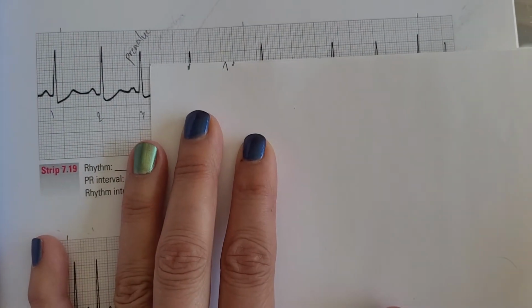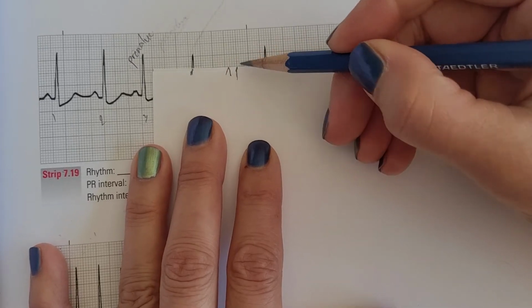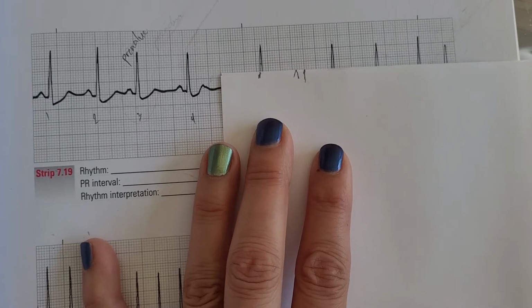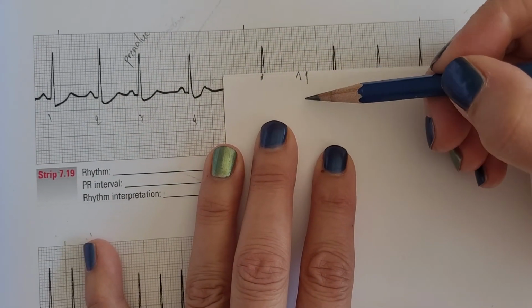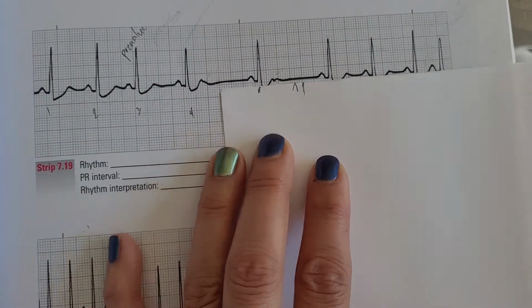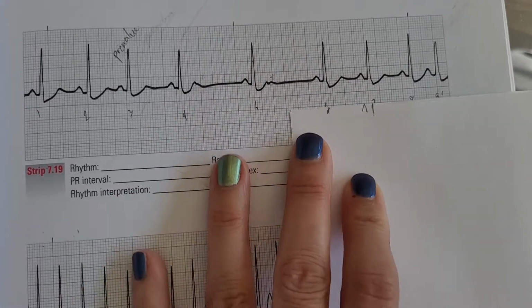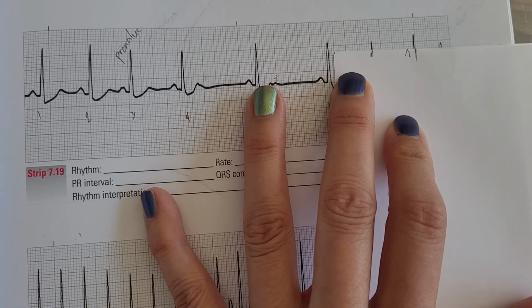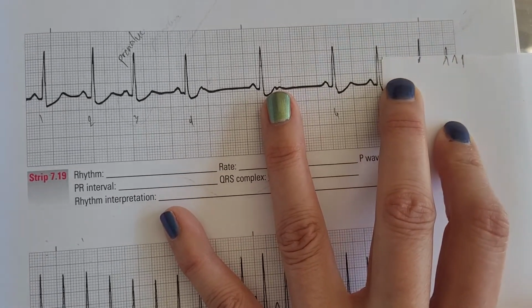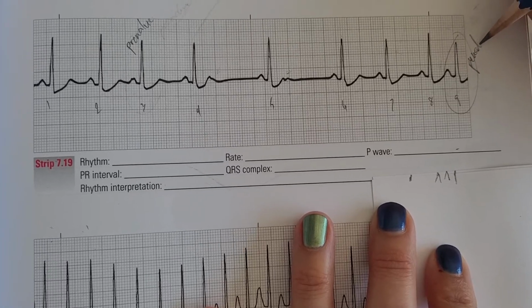Then we have a complex here, and we should expect to see something fall in here, but we don't. We don't see another complex till over here. And again, we have a complex, and again, we're expecting to see something fall here, but we don't see a complex until here. So those are a little bit long. Again, we match up complexes 6, 7, and then 7 and 8. And then we find here, this complex is also early. So number 9 is also premature.